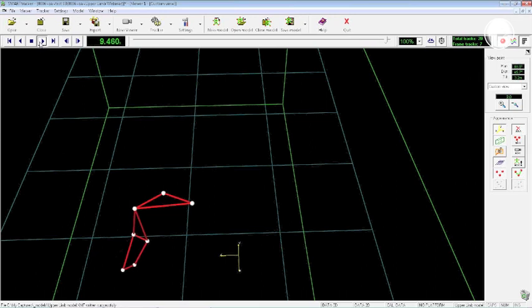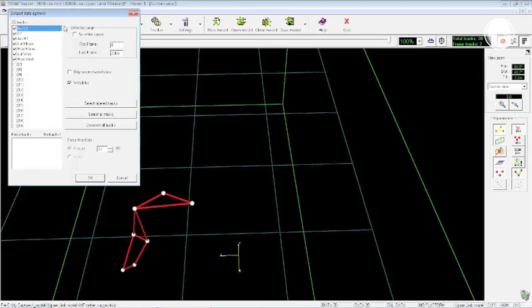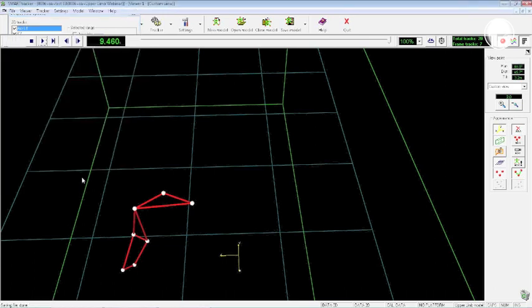And here is our trial completely tracked. I save the data. Here there are the markers recognized to be part of the acquisition. I click over OK, and my track now is completely tracked. Okay? Now we have to switch over the processing part.